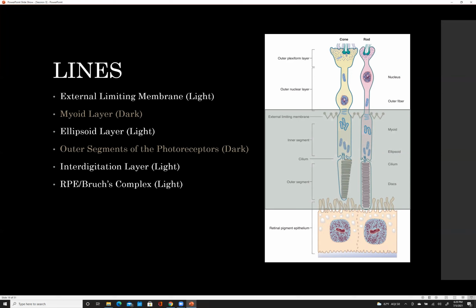And so that part of the photoreceptor actually makes up the bands and some lines. So it's literally some of the bands and the lines are made up of this huge photoreceptor complex. So just remember that. It's not that an individual cell can only be a bunch of lines and that's all it can constitute. Sometimes parts of it can be the entire band. And in this case, the photoreceptor really stretches up.